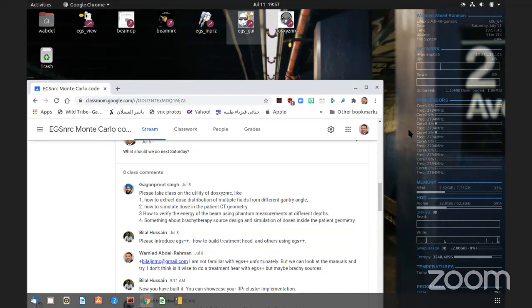I'm not sure. But anyway, you need to score the phase space file at a different distance. Especially when we're optimizing our LINAC, I could score it at 70 and then place the phantom at 100 and tell the system anything between 70 and my phantom is air. We can do that, no problem.